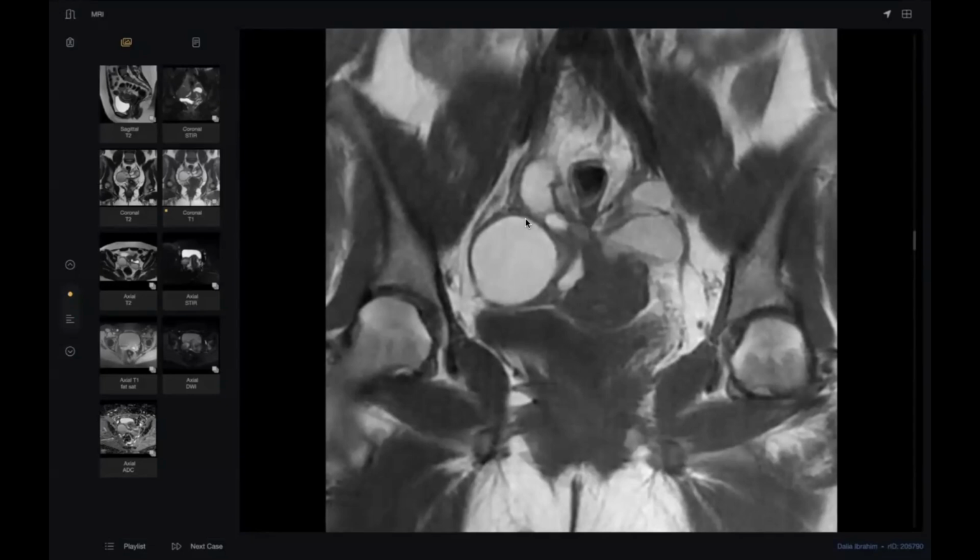They are giving the MR equivalent of the ultrasound kissing sign. There is also a layering seen in the left-sided image, and the uterus is normally visualized. And sir, I would like to see sagittal T2 once again to look for deep-seated endometriosis.